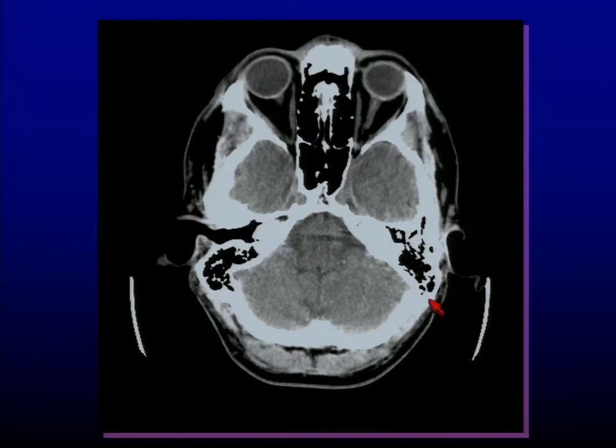So coming up a little bit further, I still see those mastoid air cells, and as we start looking at trauma, we're going to look for these. This is the area where we're looking for blood to indicate to me that someone has a basilar skull fracture. We've now got those temporal tips sitting right up against that sphenoid wing, that bony wing right there. This is where I'm looking for deceleration contusions. See the ethmoid sinuses here.